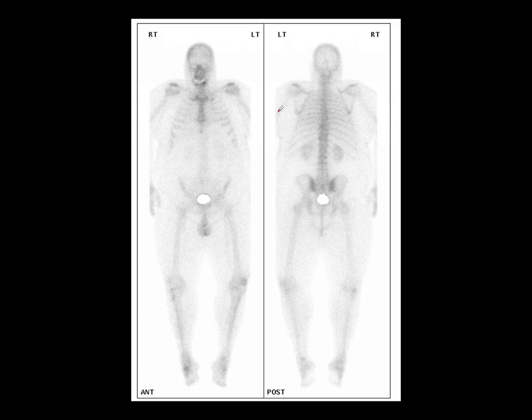A couple more sternal things here. So here's a patient just from earlier on today, actually, before I made this talk. And the patient has a couple of things. Small focal area of increased activity here, just below the sternum. And you probably can't see it, but you will in a minute. A very faint area of lucency in the lower sternum here. So I was just a bit concerned about this small spot.